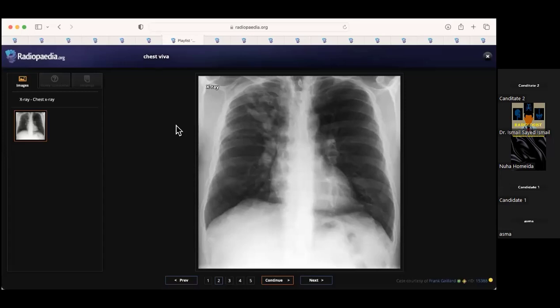The other consideration, if the patient is not known to have any asthma, will be bronchiectatic changes. Less likely, it's not the typical appearance of cystic fibrosis changes, but usually that is bilateral and not unilateral.